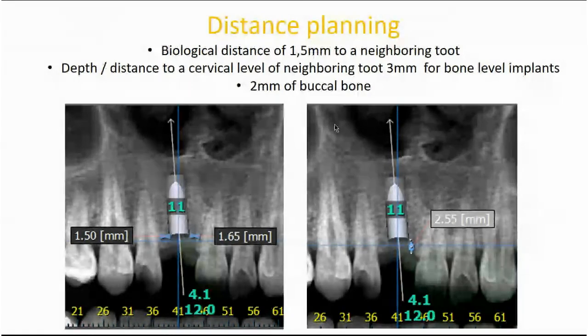And now we have more data to look at, and we will look at these data at the end, because I will try to show you how much we gain if we correlate our prosthetic plan to implant assessment, and we will do the procedure of how we correlate the intraoral scan to the CBCT scan at the end of our presentation.